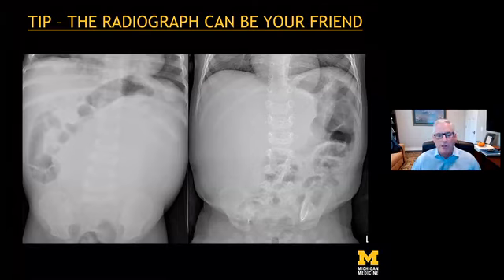And so if we take a look at these two images, we see that there's clearly mass effect within the abdomen. And if we take a look at the image on your right, there might be hepatomegaly, maybe perhaps there is a mass. We can start to look for other findings, such as, do we lose any fat planes? For example, the psoas margin, or the retroperitoneal fat planes higher up by the crus of the diaphragm. We can clearly see that there's mass effect and the bowel is pushed over. When the colon especially is pushed over, we often think about retroperitoneal tumors. In this case, this is a patient with a known neuroblastoma at subsequent imaging.